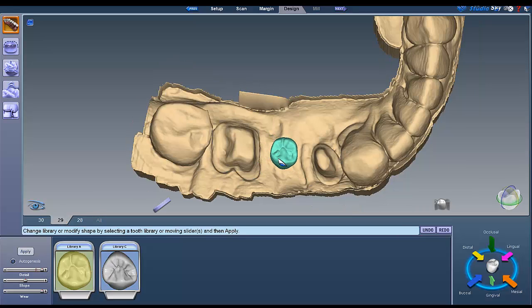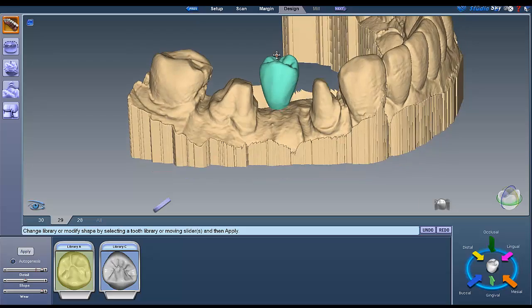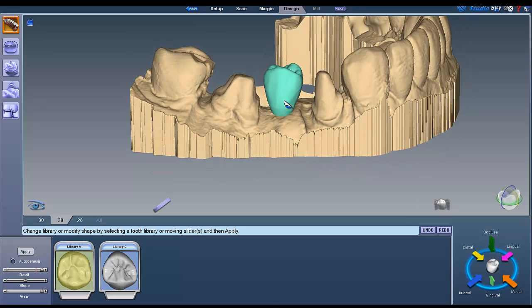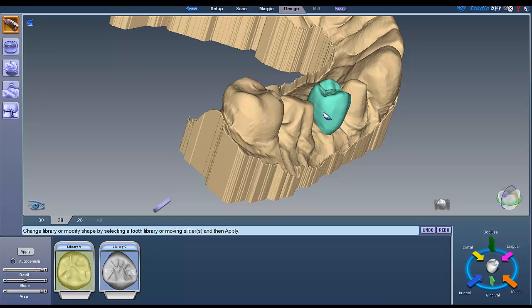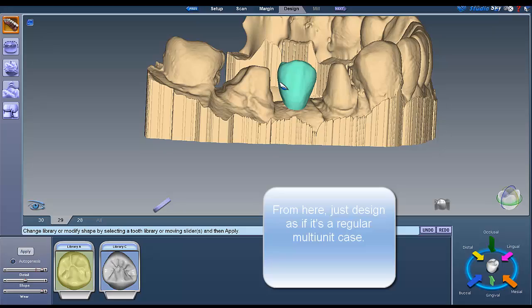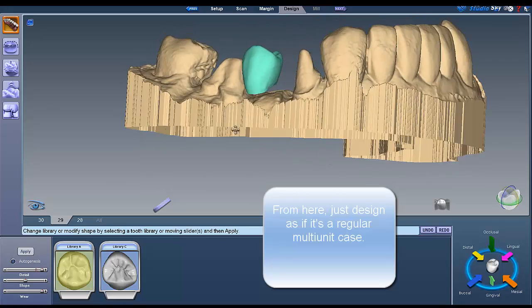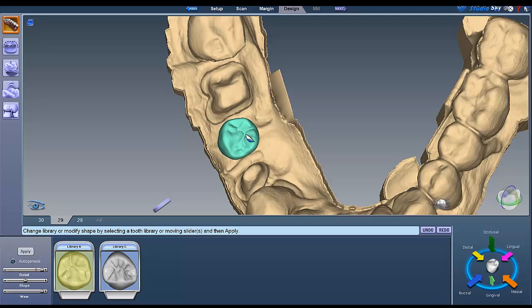And again, Alt and arrows to resize that. And bring that right down here. So one tweak I would like to see in the software at some point would be for the proposals to stay in place that we've just done, to see those proposals, so it would help in a case like this to be able to position our green tooth so we know relative where that crown ends.